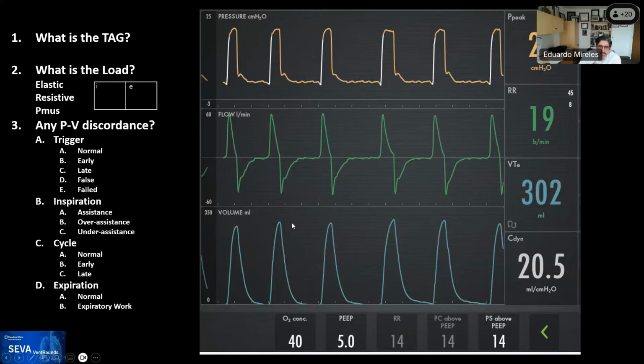And this happens relatively often to us when we are weaning patients from the sedatives and they start having reverse trigger or early trigger. The response of the team sometimes is to resedate the patient. And again, as we talk about goal-directed ventilator management, your goal will define what you do. In this case, if we're trying to aim for comfort and waking up the patient, then this type of breath sequence may help you get out of that pickle.